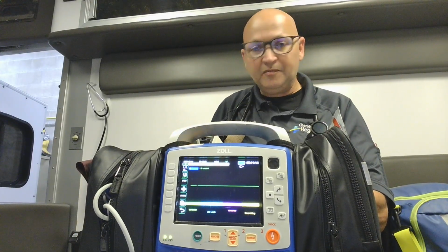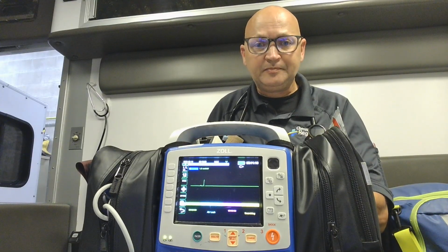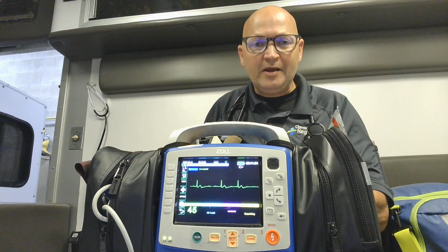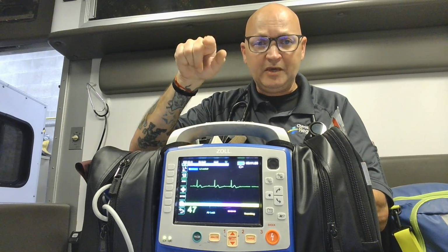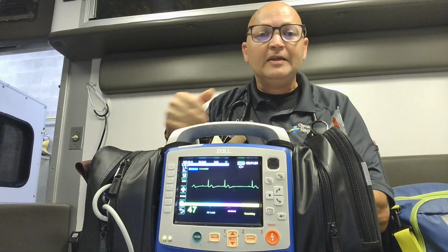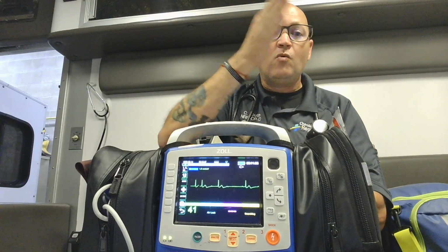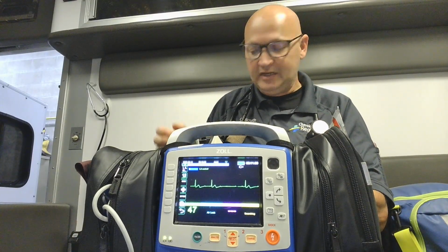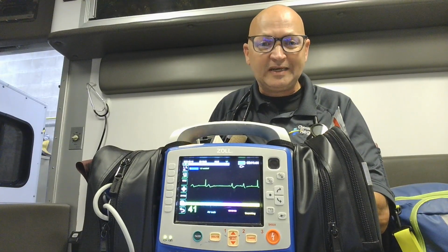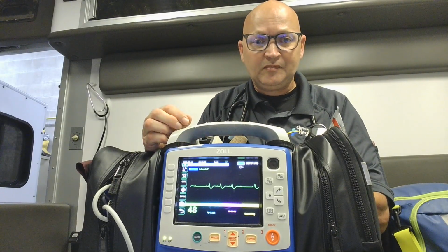The first one I want to show you is known as Mobitz type 1. The PR interval, which is the distance from the P wave to the QRS, gets wider, and then it drops a beat. This rhythm is also known as Wenckebach. The way to remember it is wider, wider, Wenckebach when it drops a beat. And this is Mobitz type 1. Mobitz type 2 is the following, also known as a classical heart block. This is where we have more P waves than QRSs.